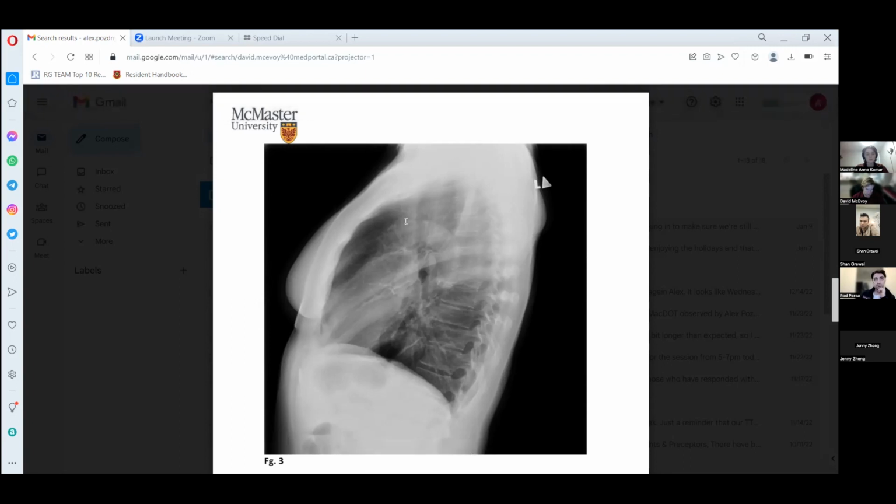You can also see the lungs here. You can see that we have a little bit of a darker area, which is totally normal and actually expected. If you stop seeing a dark area in this part of the lateral view, this might point you to several things. It might point you to some anterior pneumonia or consolidation, some mass inside the lungs. But importantly, it can also point you to a mediastinal mass. So this would be the anterior compartment of the mediastinum.